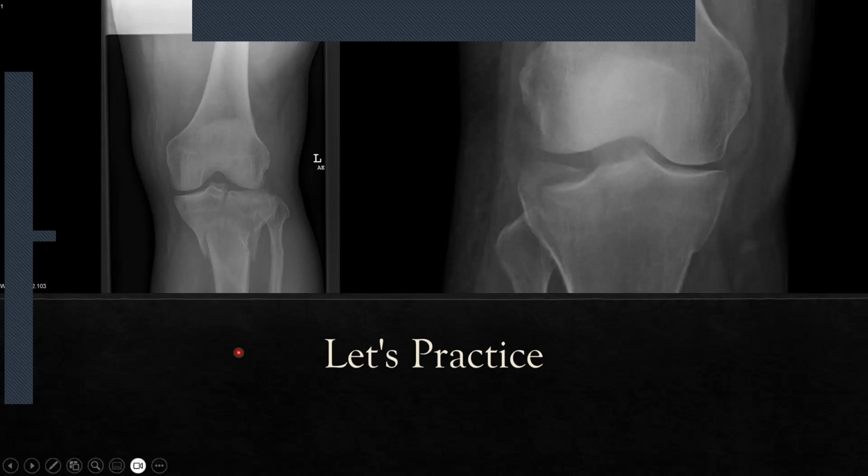Okay. So if you've done that, or if you've just decided to carry on listening, here we can see this is quite a severe fracture of the tibial plateau. We can see the entire medial end, the lateral end, even the fibula have all been fractured. You can see there's a lot of swelling associated, soft tissue swelling. You would find a lot of lipohemarthrosis going on over here. We can even see what looks like air pockets. So this could be an open fracture as well. It's difficult to say from an x-ray, but it could well be an open fracture.